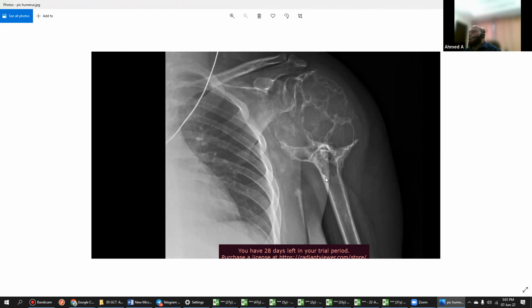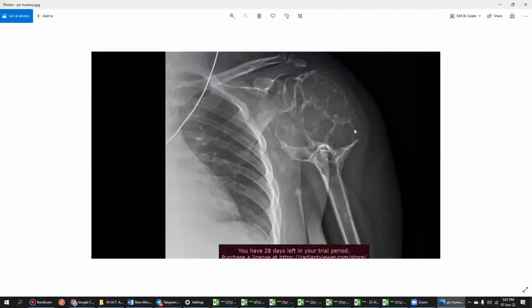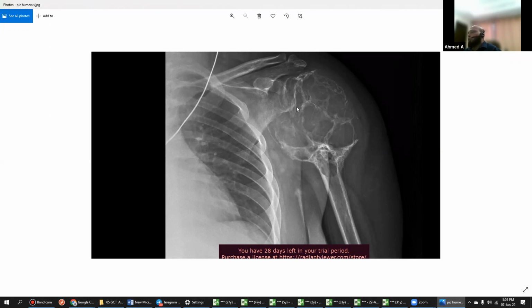What I'm saying is, you need to say that the transition zone here in the inferior aspect appears narrow or sharp. And rest of the things, I cannot find any bone marrow or any bone cortex. The bone cortex is irregular and it is an expansile lesion with subarticular extension. So this is most likely to be a locally aggressive giant cell tumor, GCT. Because anything expansile, and this is not eccentric, and this is not even corresponding to the age. ABC is usually at a lesser age, and also it will be more of an eccentric thing. And you don't have a simple bone cyst to say fallen fragment and all.